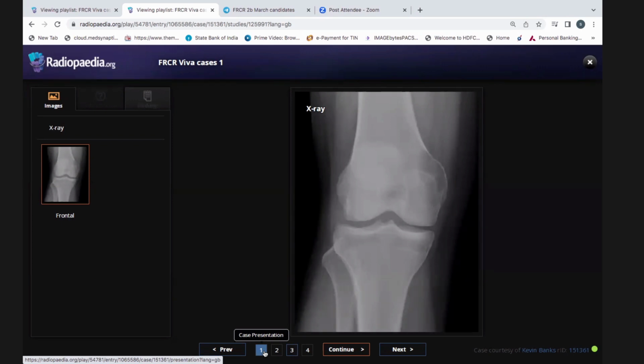The patient is 25 years old. I'm also worried about any manifestation of osteomyelitis in this patient, so I need to correlate with presentation and further MRI of this case to characterize.